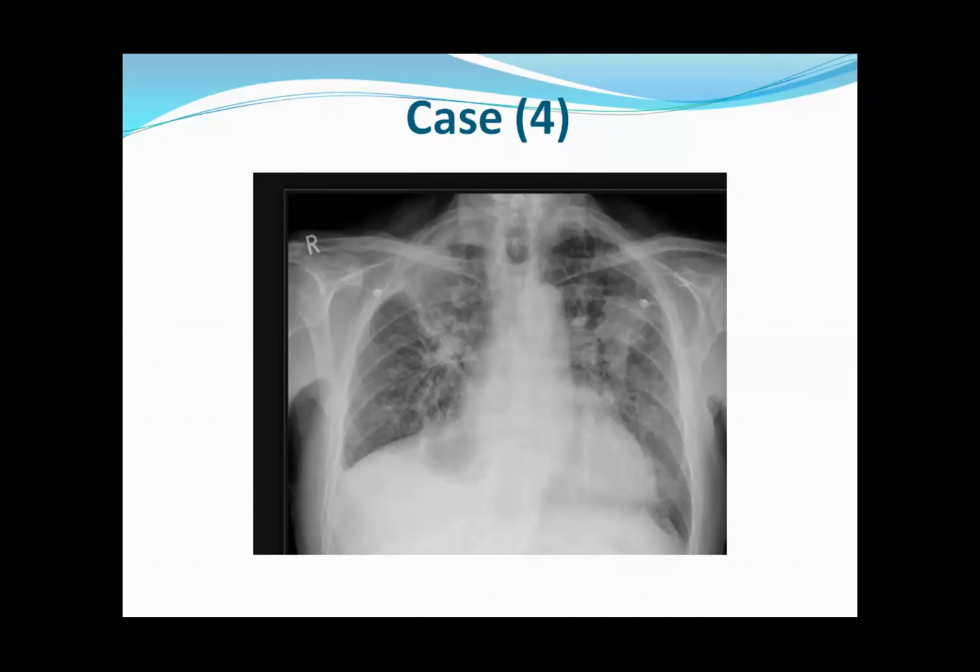Frontal radiograph of chest of an adult patient showing multiple radiopacities in bilateral lung fields. These do not conform to any particular segmental distribution. So in this, these are pleural calcifications. Where do you see pleural calcification? This amorphous type of calcification in the left upper and mid zones.